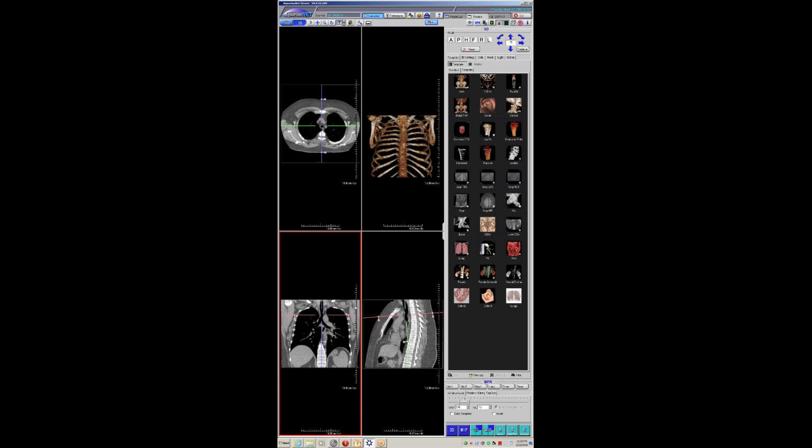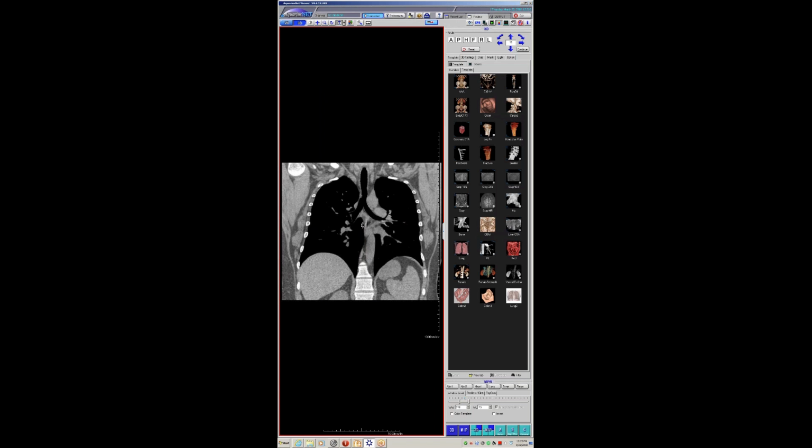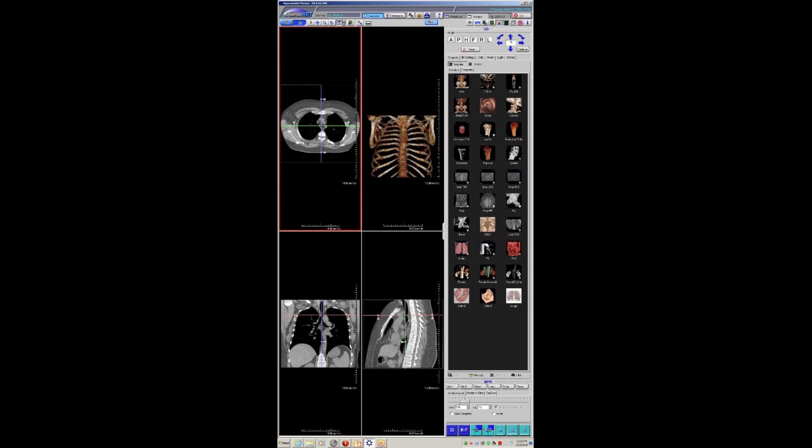What you said at the first was correct, in that so-called pericardial plaques are actually pleural. So it's the adjacent mediastinal pleura that's involved with plaque. I've never seen one on the undersurface of the heart. I've seen them along the left heart border, but those are medial parietal pleura along the mediastinum, not really pericardial, although they're called pericardial. It's in quotation marks.